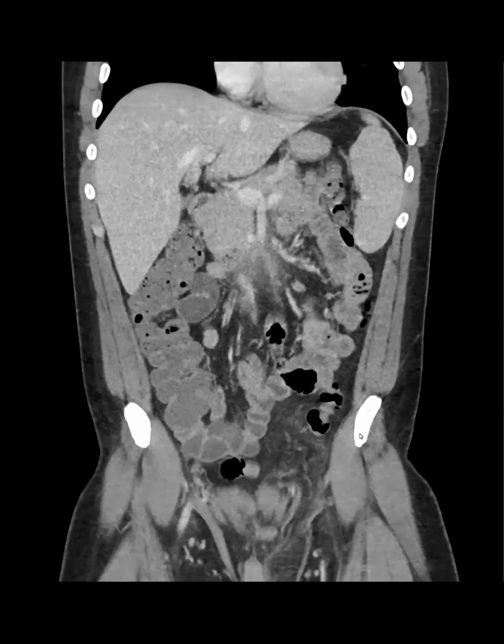It can be from very low grade dysplasia with well-organized glands to very bizarre looking architecture as it goes from low grade to high grade. So that's something I learned is how they look at IPMNs under the microscope. So ours would, I imagine, be somewhere in this category, where the T2 bright areas were mucinous because they found the same things, but on their special stains, all of it was positive also.